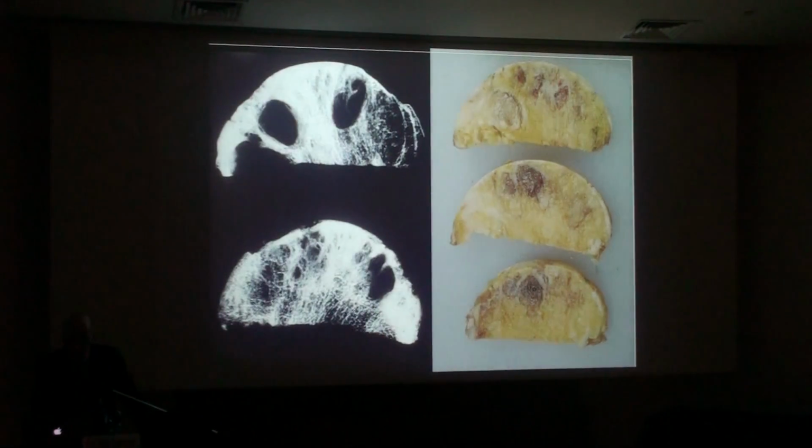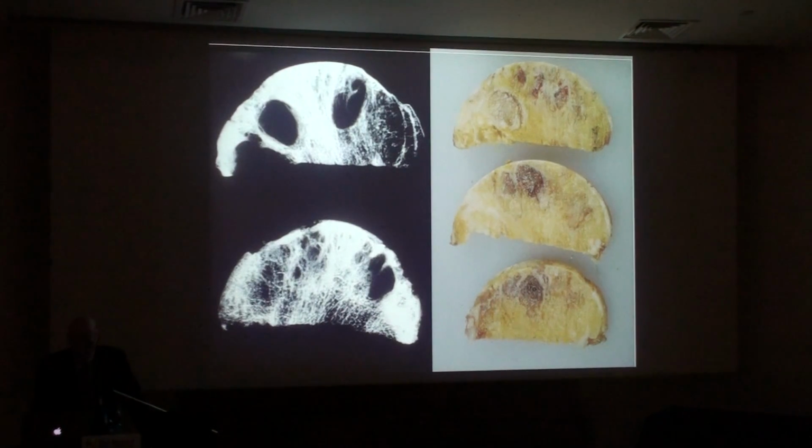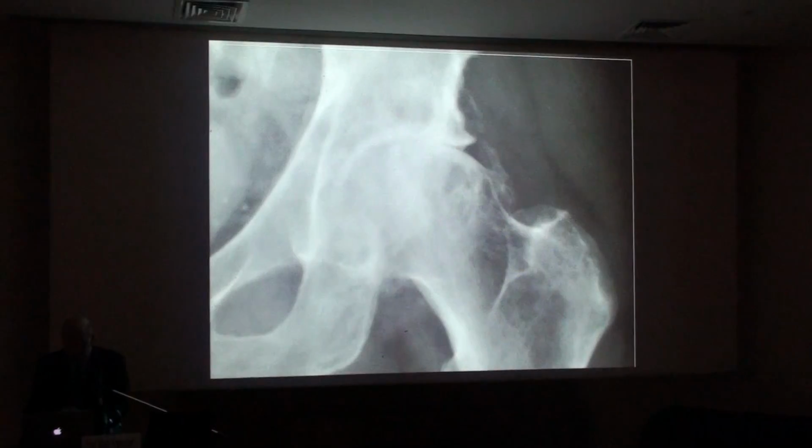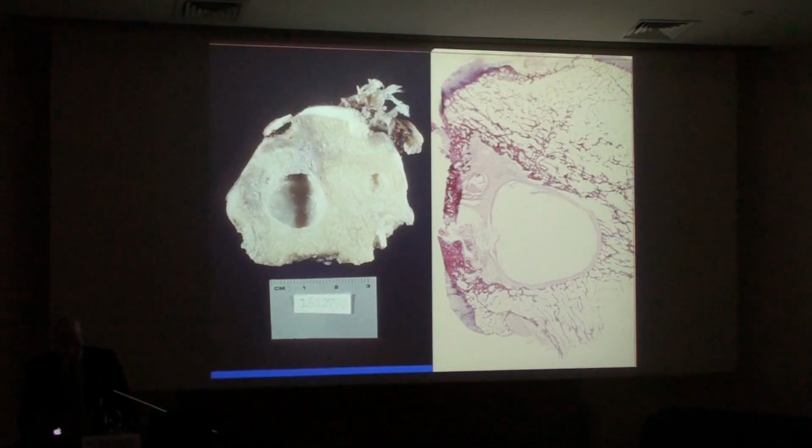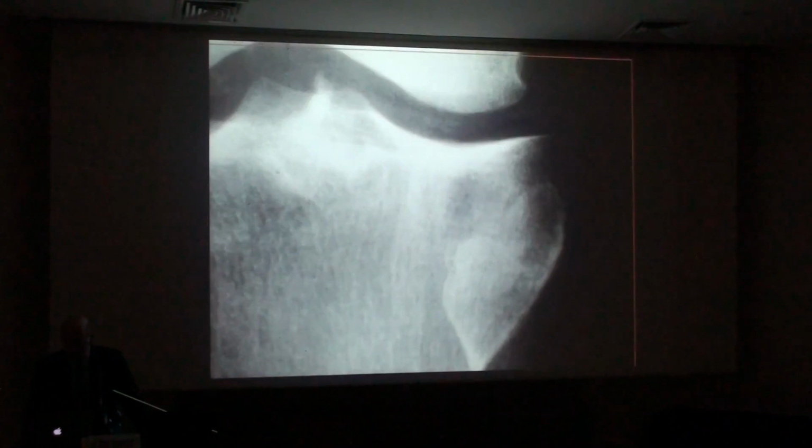And here, a very degenerative femoral head where you can see these cyst-like changes, and you can see this solid-like material. Again, this is more like a gelatinous material that can liquefy, but often it's this more dense myxoid gel-like material that fills them. Here, again, subchondral degenerative cystic change, a very arthritic hip. And this one, of course, had liquefied with a nice, almost glistening pseudo-epithelial margin within it.